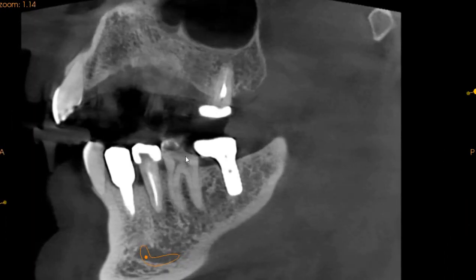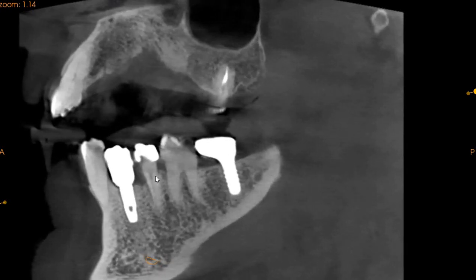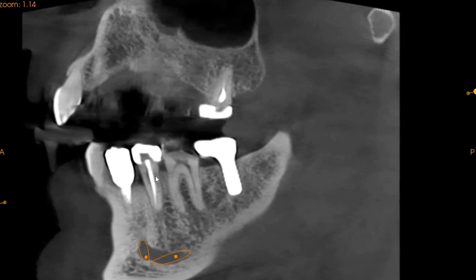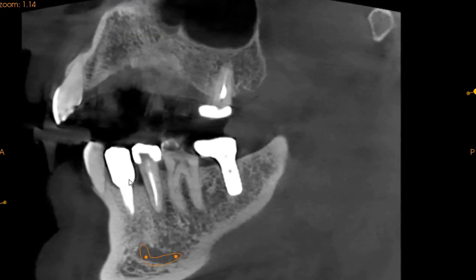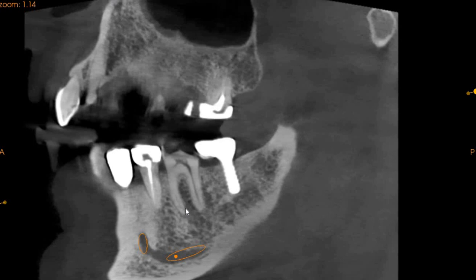This is the sagittal view. On the sagittal view, we can again see voids present associated with the obturation, but we don't see any major cracks propagating from within the tooth. The other significant finding that we see with cracks is a J-shaped radiolucency or a periapical radiolucency, which is not associated with this tooth either.